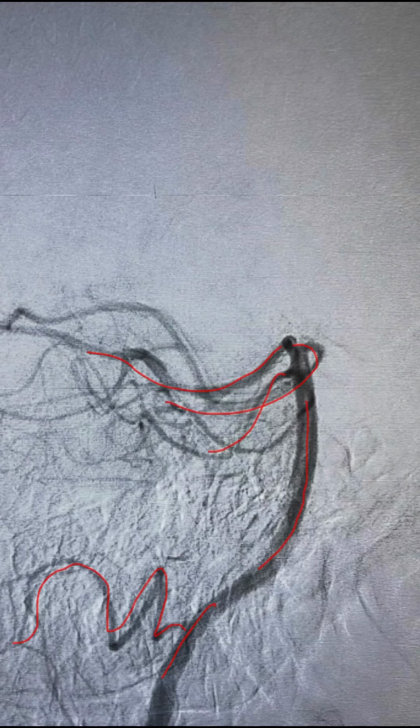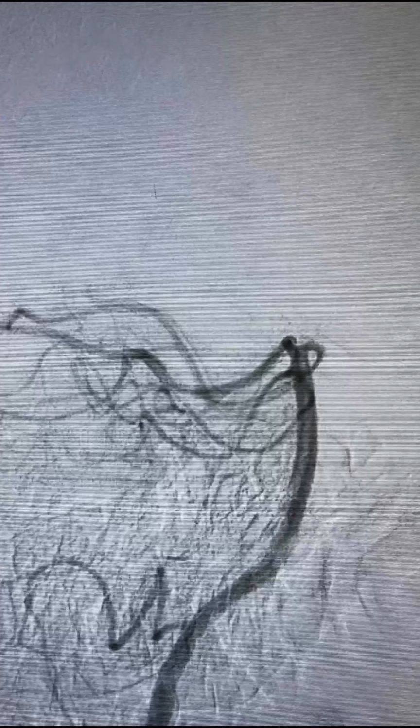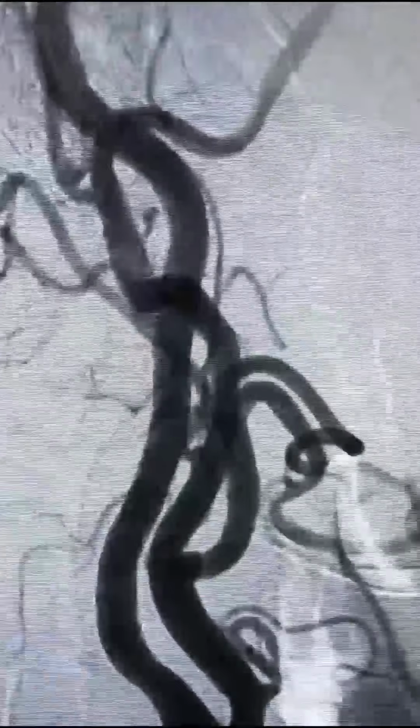Clear? Where is the PCOM coming? PCOM should be going to the front. PCOM should be coming here. So in the lateral view, if you see a vessel like this coming, that is the PCOM. Here, you don't see any vessel coming anteriorly. That means there is no PCOM here, and PCOM is not supporting. And you don't see any pial vessels also coming here. Normally the pial vessels should come like this if there is a collateral supply. That also is not seen. So the inference from doing this vertebral angiogram is that the posterior circulation is not supporting the anterior circulation.